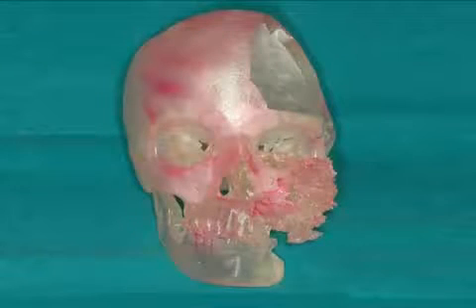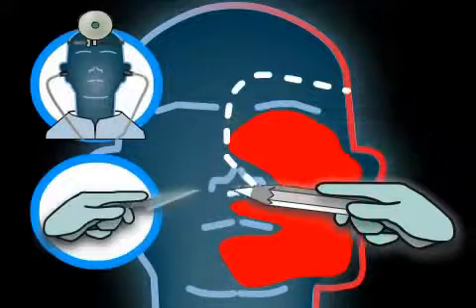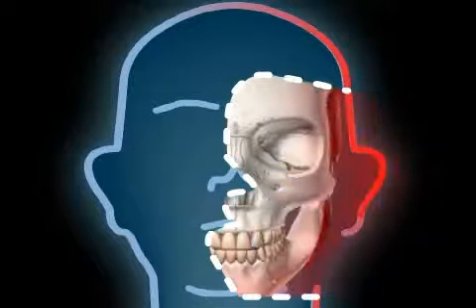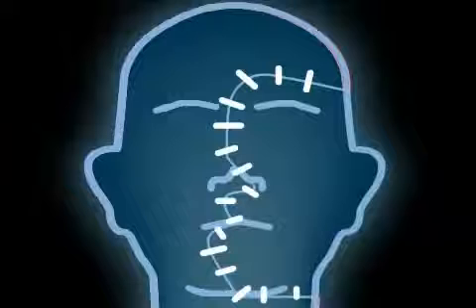Here you see a stereolithographic model of a patient with a malignant tumor. Fortunately, with the use of the model, the surgery can be planned. The incisions, in effect the so-called resection boundaries, can thus be determined in advance. After the removal of the tumor, the face will be reconstructed with the exception of the eye. Such planning models help surgeons anticipate the course of surgery in advance.